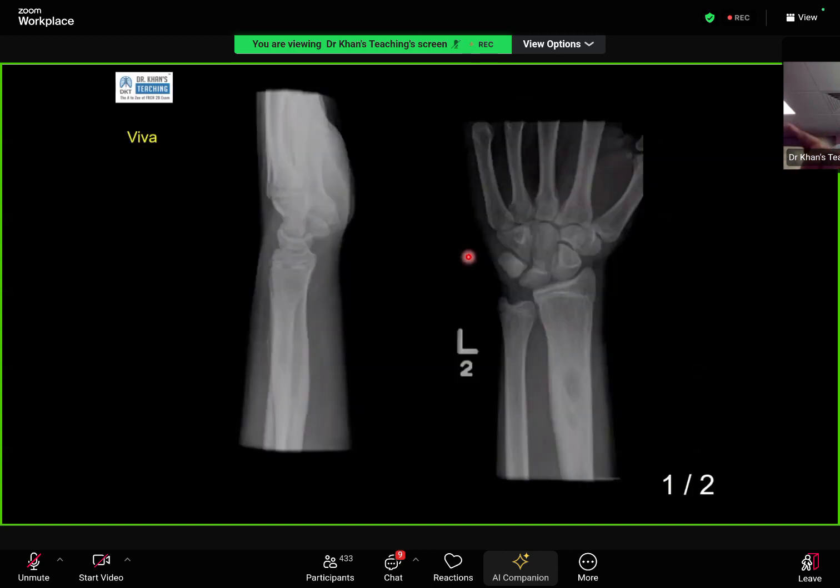Okay, this is the case for which I showed the MR to candidate 1 initially, and I'll again show you the MR, but can you describe your findings here? Yes. It's a classic, very good case. So, lateral and frontal radiograph of the left forearm and wrist joint of a skeletally immature patient. There is an ill-defined oval-shaped lucency seen at the distal diaphysis of the left radius bone with surrounding sclerosis. There is also some surrounding soft tissue distension seen on the lateral view.